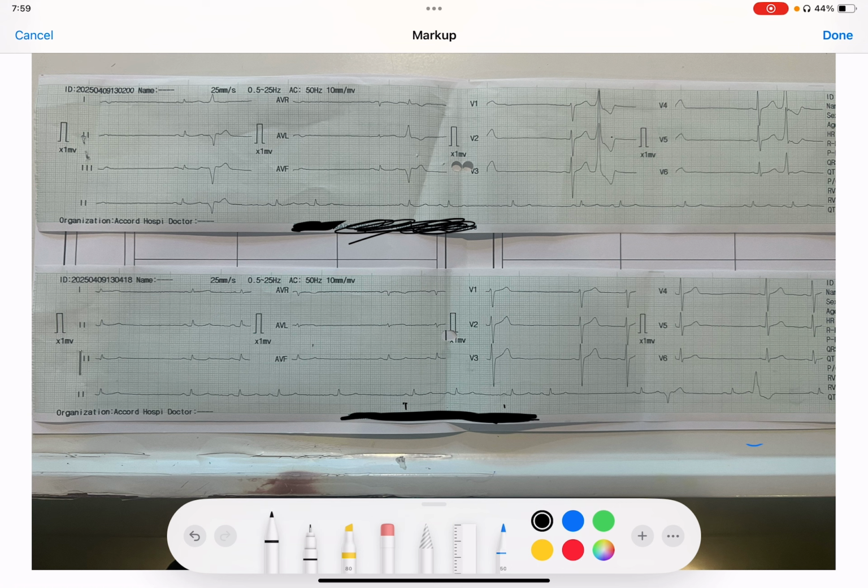But there was a component of degenerative sinoatrial node dysfunction, which we call sick sinus syndrome, because the effect of atenolol should go away at least after 3 days. So even after 3 or 4 or 5 days, if the heart rate still remains lower, then the chances of getting syncope, giddiness, fall, and stroke will be very, very high.